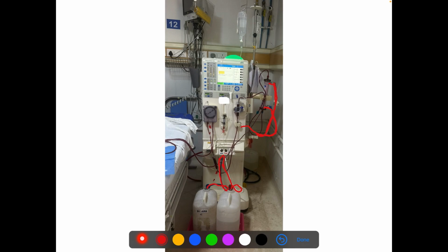The dialysate circuit, how to know the concentration? There are again few components of the dialysate circuit. There is one sensor there that measures the conductivity of the sample. Now since this dialysate fluid is a mixture of acid and base, along with RO water, there is an electrical charge to the fluid. So there is a monitor inside which senses the conductivity of the fluid because it contains electrolytes, and from that it can know the concentration of the various electrolytes, and if there is any difference, any wrong mixing of fluids, it can detect it and there will be an alarm that shows the conductivity of the fluid.